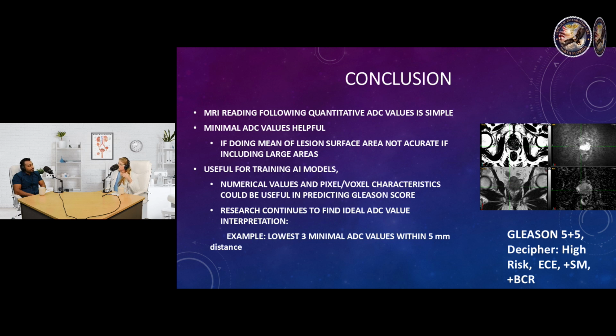Actually, we had that conversation with Manish in the past about how we can make this work, and whether we could use ADC min for these tumors. Manish came up with an excellent idea of looking at all the minimum values, picking the first quartile of minimum values, and using an average of that as a way to grade tumors with ADC mapping.